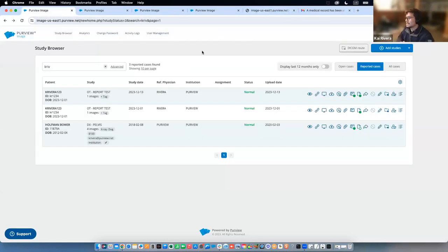But also, as you might know, in DICOM, there's a destination, right? So usually an IP address, application entity title, AE title, and a port number, right? So with a combination of those things, you can have your imaging modalities, whether it's CT, X-ray, nuclear medicine, all those things, send directly to the cloud server so that when somebody logs in, they'll be able to see the scans here.